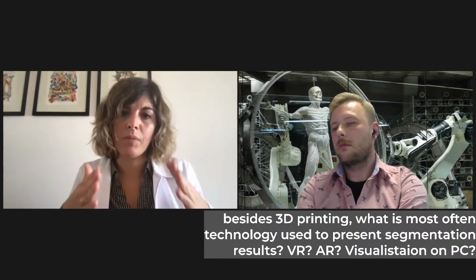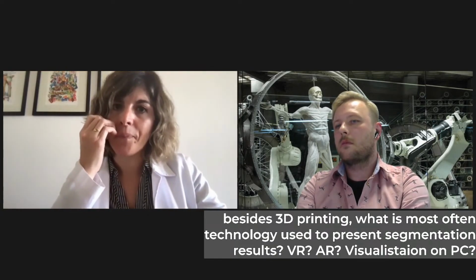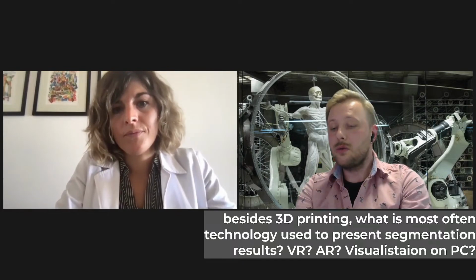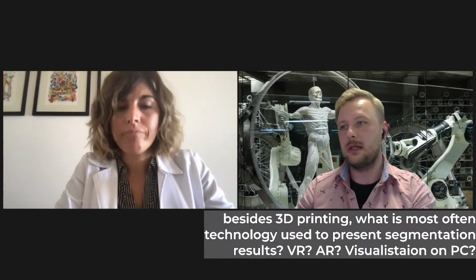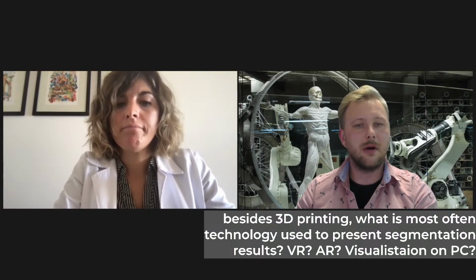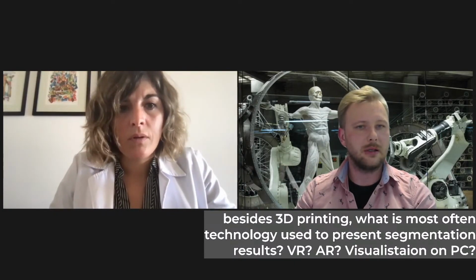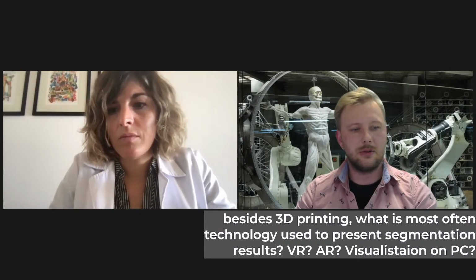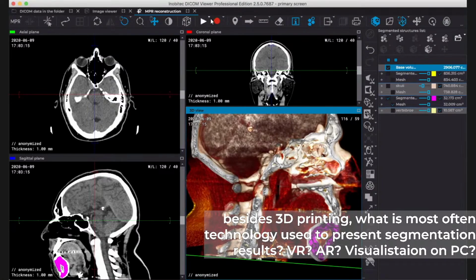Whatever they need, the video is focused to show them the critical parts of that surgery. So you can use our program not only for segmentation, for the key purpose. You can also use it as a means of communication with the surgeon, and we have the functionality to record the video from the screen of the program, so you can record it directly from the program and send it to the surgeon. Yeah, this little button here, you have it.